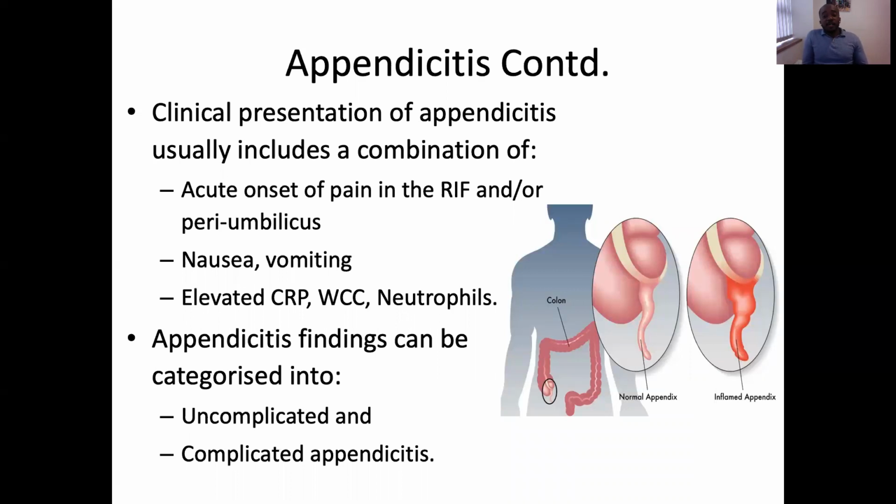But if you can find a normal appendix on ultrasound, the patient doesn't need to have a CT scan. It's just always appreciated if you can confidently find it. You don't want to make things up and misguide the clinician.